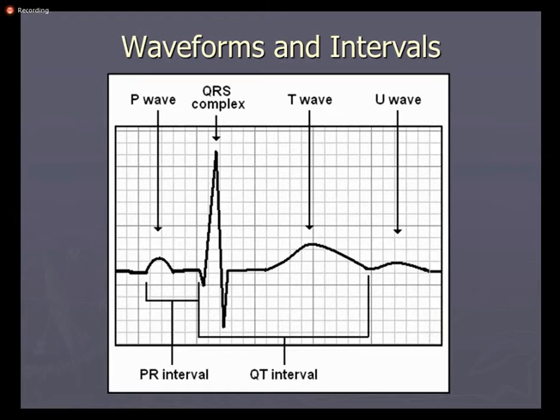We have some other waves also, for example a U wave, which may form in some electrolyte abnormalities. So now I think you are able to understand what is a wave, what is a complex, what is a segment, and what is an interval.